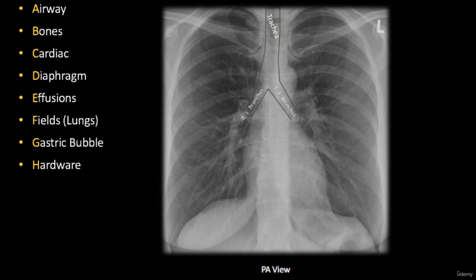Or when the patient has some foreign objects in the bronchi. Other pathology which can change the normal picture of the trachea may be the growth of a tumor or enlarged lymph nodes. If they are severely enlarged, the trachea could be pushed from the midline to the right or to the left. The same is true about the arch of the aorta. By the way, if any aneurysm or dilation of the ascending aorta or arch of the aorta is present, that may cause deviation of the trachea from the midline.